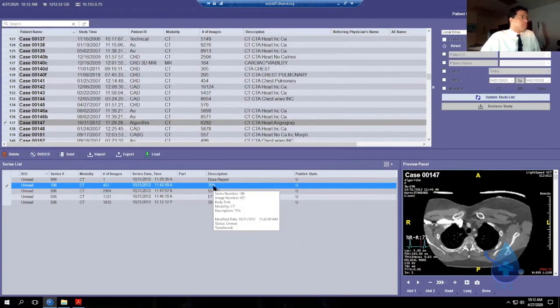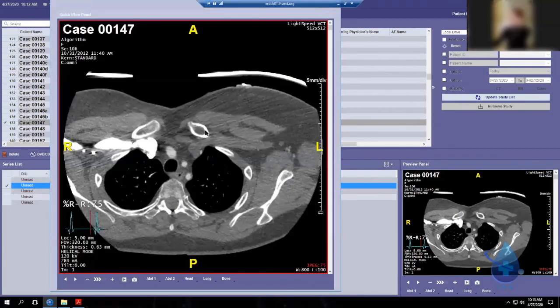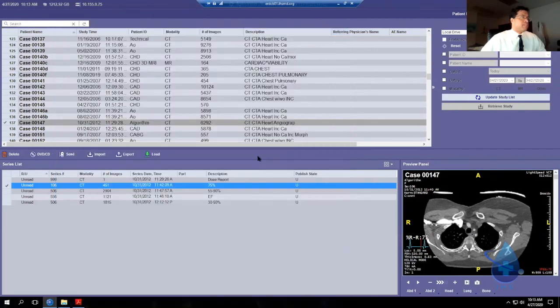And then you use the 75%, which is the large field of view, for step 3 in the algorithm, which is called thoracic housekeeping. If you look on the 3rd page of the algorithm, see where it says thoracic housekeeping, step 3. When you get to that step, that's where you look here on this series, okay? So that is the methodical way of using these series.